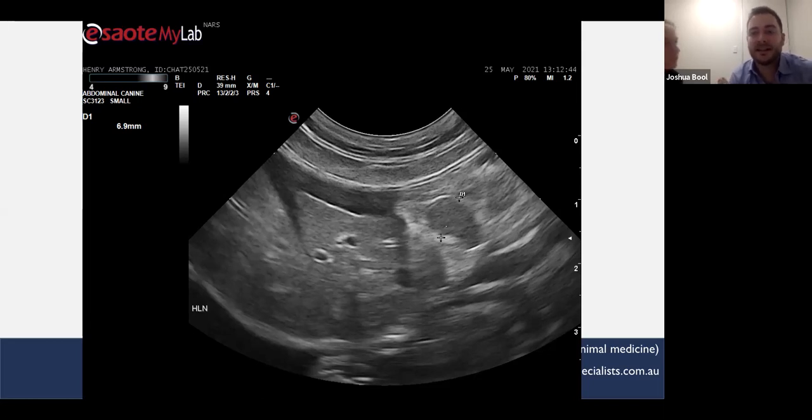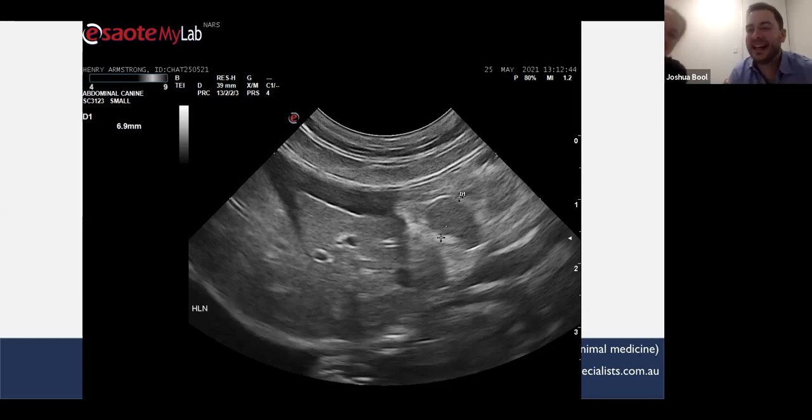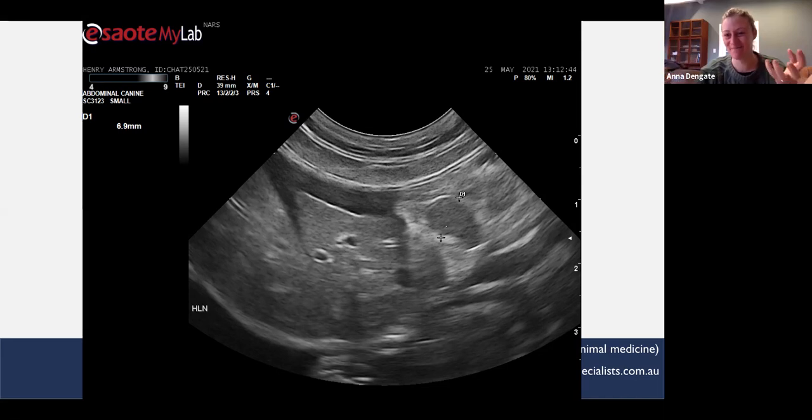So you'd think that the walls would be hyperechoic, even though that's potentially not actually a true medical thing. It's just a good way to remember it. I meant just that the portal vessels are bright, but the hepatic vein walls aren't, so you can tell the difference between them. Yeah, that's how I remember it.